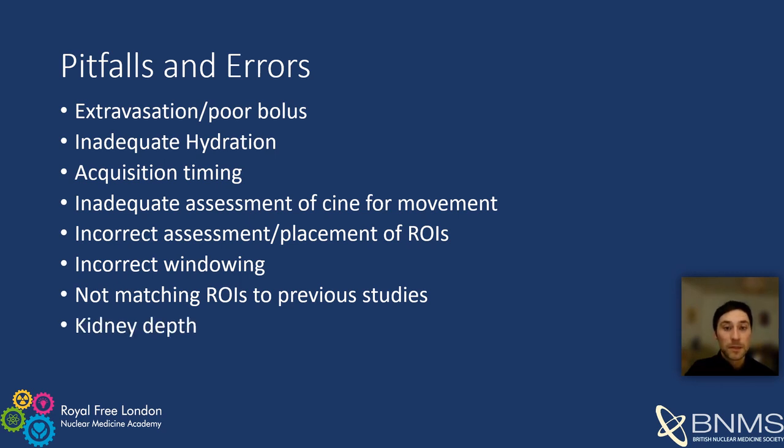If the kidneys are not the same depth, then attenuation will be different. Finally, don't mistake the gallbladder for the kidney.